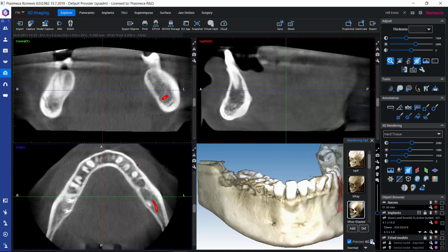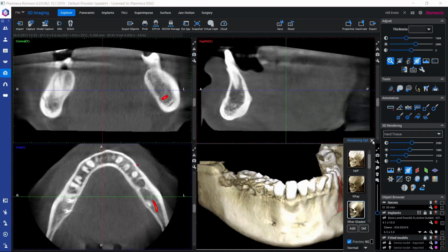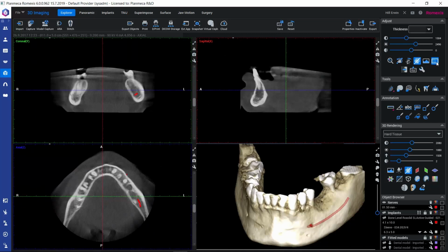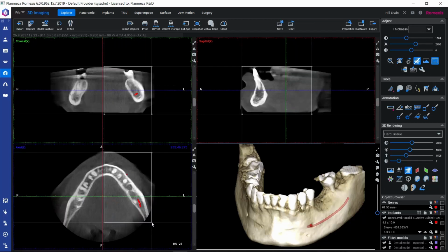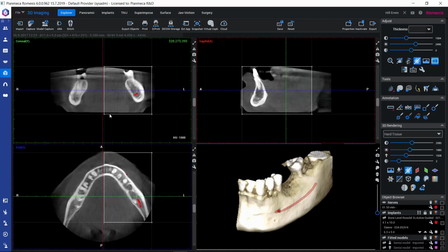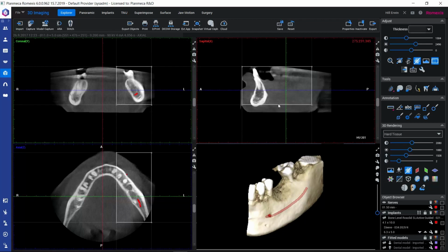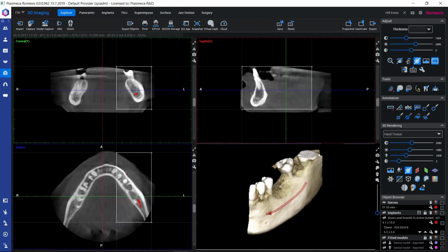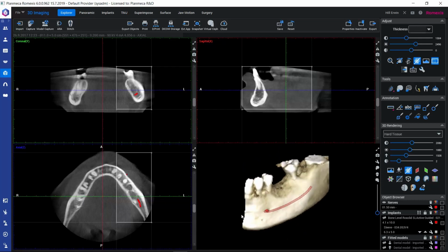And then we have one more way for cropping just part of the volume. So we could, for example, examine just the left side of the volume. We have this crop volume for 3D rendering function here. When we activate this one, we can draw a rectangle on any of these slice views. So for example, if I draw here a rectangle in the axial view, I can still adjust it here in the other views in order to determine exactly what part of the volume will be taken into account in this cropping. So like we see, this cropping applies just on the 3D rendered view.